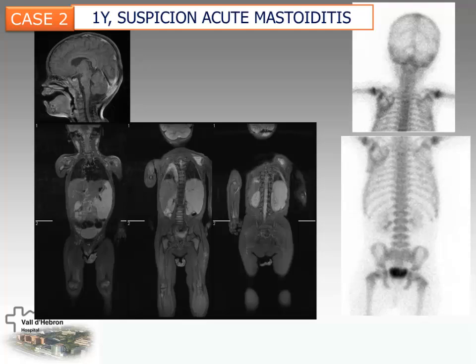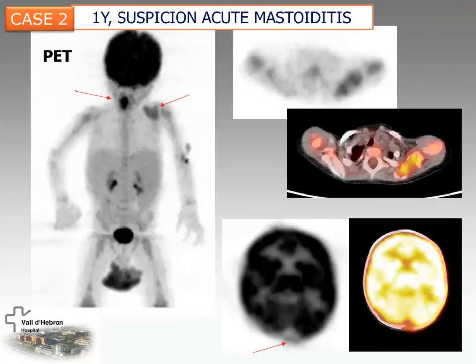Yes, but on the planar images, can you see the left scapula? Yes, very well. It seems to be insufflated, isn't it? This was not detected by MRI. They missed the scapula. Okay, and then fused images. We perform under the suspicion. What was really the end diagnosis?